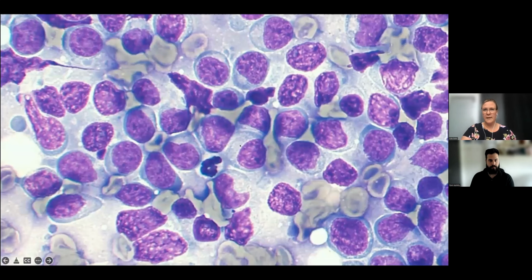And when we're looking at lymphoid populations, I've already told you that they're large lymphocytes, but you might be wondering, well, how can I tell that they're large? The reason we want to know whether they're small or large is because if we had a population of primarily small lymphocytes, that actually could just be lymphocytic inflammation. It could have been that you hit lymphoid tissue within the GI tract. That sometimes can happen. Or it could actually be small cell lymphoma, but we need extra testing to make that diagnosis.